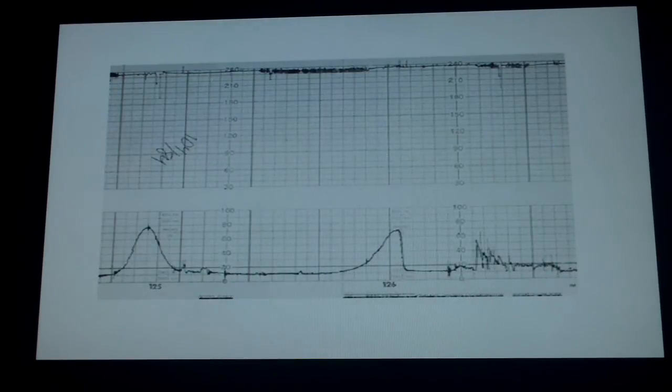This one I included because I want to make you aware that in some cases it's a fetal tachycardia because there's something going on. It might be benign, it might not, but obviously you're going to check with your provider, and they're going to evaluate this because the patient may have to be transferred for digoxin or some medication treatment to help that baby to convert its heart rate.